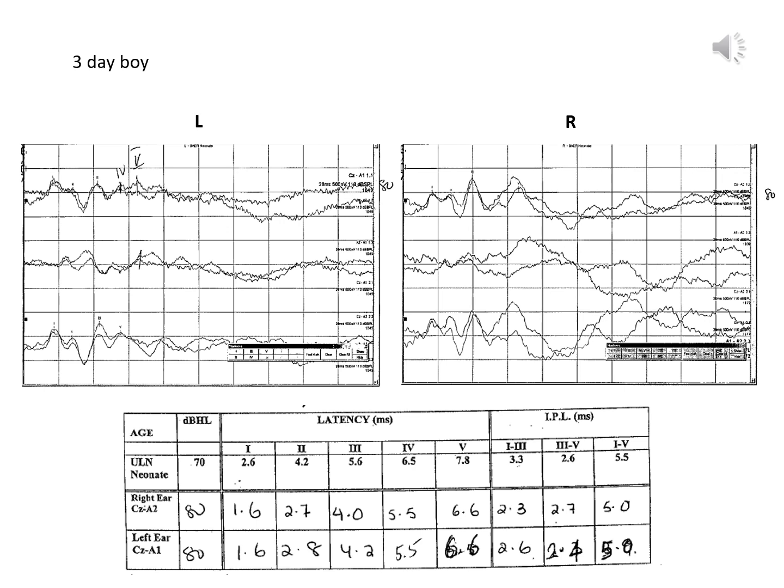And so we can see a clear wave 1 and 3 in the left ear, and the wave 5 is not so well formed. And so this might be okay. It's hard to say, but the wave 5 is immature at this age. On the right ear, though, the 1, 2, 3, and 5 are all very clearly formed. And so it's nice. We can identify our waveforms.